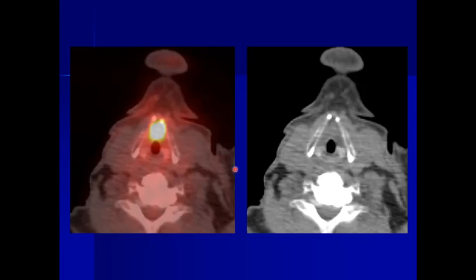I want to compare it to this patient who had an oropharynx tumor, a tonsil tumor. This is their post-treatment scan, 3 months post-treatment. And there was FDG activity not laterally but anteriorly in the larynx. The surgeon did an endoscopy and saw absolutely nothing. We presented it in tumor board, and they were saying, well, this is nothing to worry about. And I said, whoa, this is a PET CT. And remember that this is a low resolution scan that we use to do reconstructions of the PET. It's good for localizing, but it's not good for high resolution anatomy. I said, this doesn't make sense. Let's get a larynx CT.